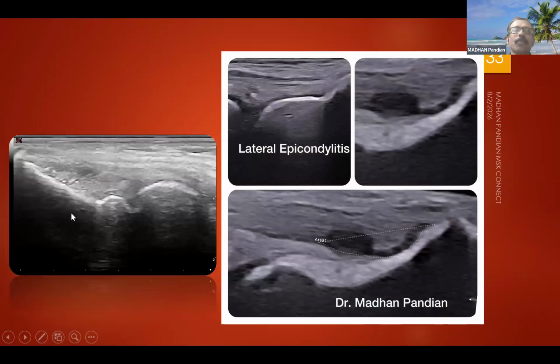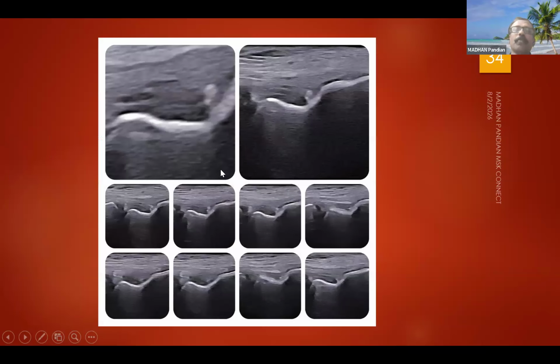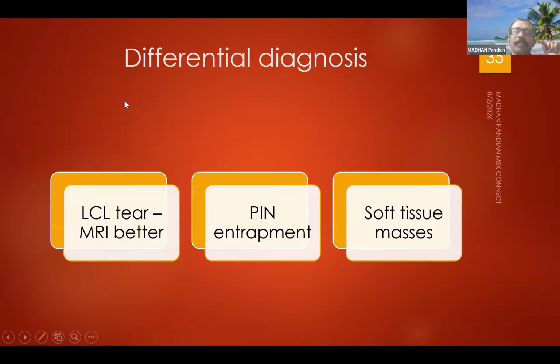So this is how exactly it looks pathologically. There is a heterogenic tendon, there are hypoechoic areas and there are hyperechoic areas. You can see the cortical irregularity and the stippling of calcification there. And you can see sometimes a tear, which is a slightly extended tear. There could be an enthesopathy. So all these are common changes. See, small tears, the micro tears, occur because of repeated activity related friction. So there will be a lot of micro tears, which actually need an intervention by regenerative therapy.